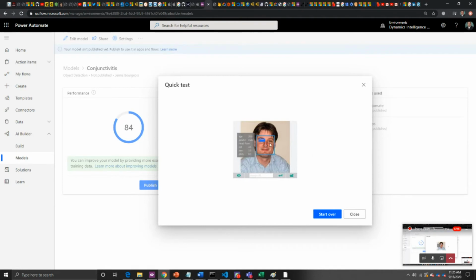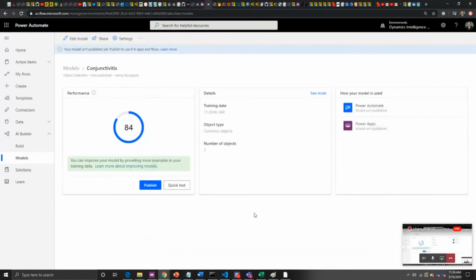Now, again, why would this come up with only 33% when perhaps we think that he doesn't have it? It just comes down to the images that we use and what we selected. So if we wanted to refine this, we could go back and do these again, and we could use either different images, or we could use a different selection criteria. Like I said, I selected the whole eye. You see that is kind of indicating maybe not as much accuracy as we would like.